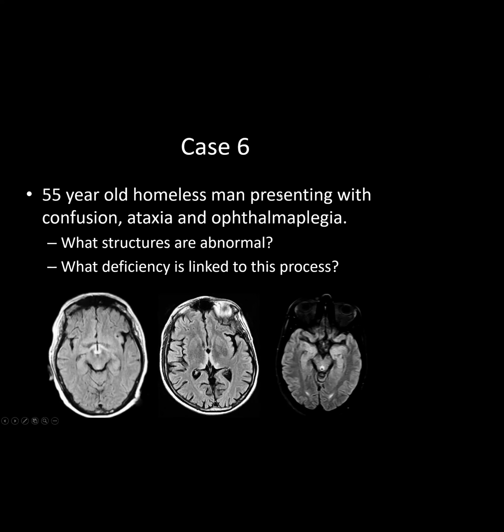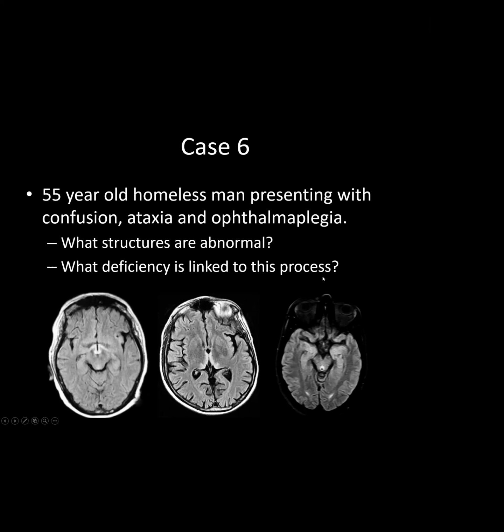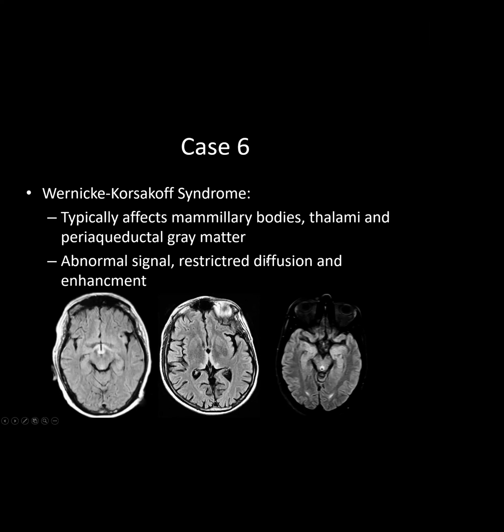Wernicke's encephalopathy. Right. And what's it from? What deficiency? So it's B1, or thiamine, deficiency. For imaging, classically they talk about involvement of four different structures: the mammillary bodies, the hypothalamus in front of them, the thalami, and very commonly the periaqueductal gray. It's okay to have a little bit of bright signal around the ventricles and around the aqueduct, but when it's very confluent like this, then I start to worry about that.